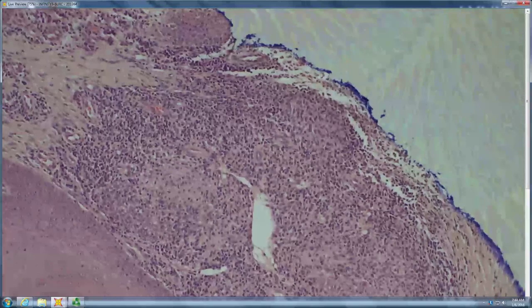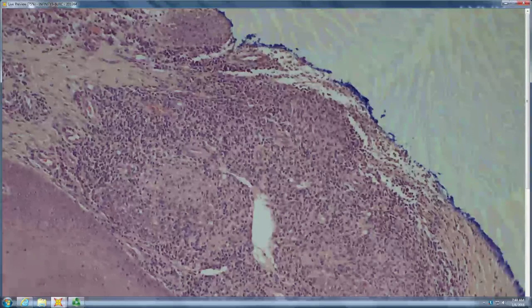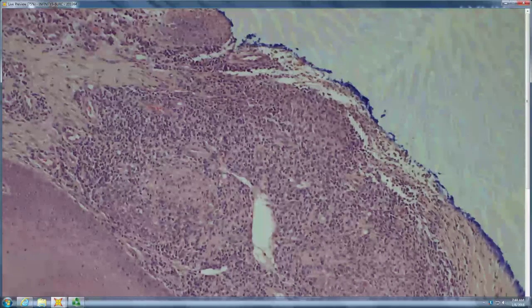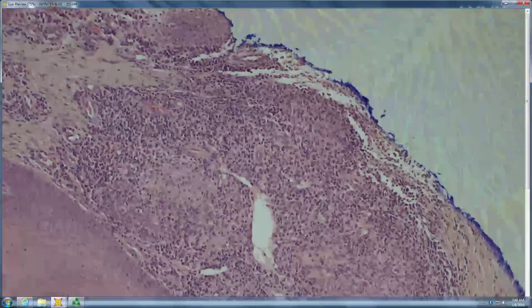Syphilis can look like this. And then you've got Crohn's. So cutaneous Crohn's absolutely can look like that. Zirconium and beryllium granulomas can look like that. They tend to be a little more sarcoidal than tuberculoid, so fewer round cells.